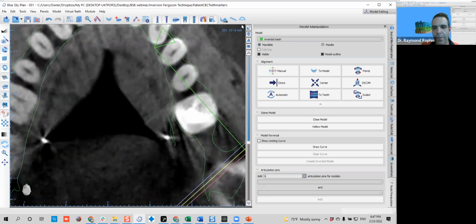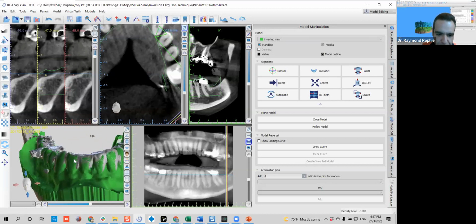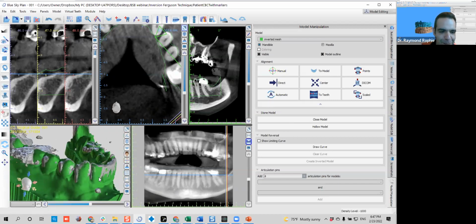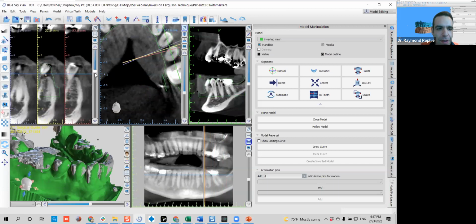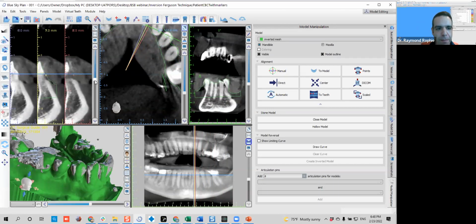Yes, this will work. And if I would like to fix that area because you want, for some reason, you want to be a perfect guy, of course you want to do it. You just position yourself on a point that you know that is clear for you that it was not perfect and that it's constant.